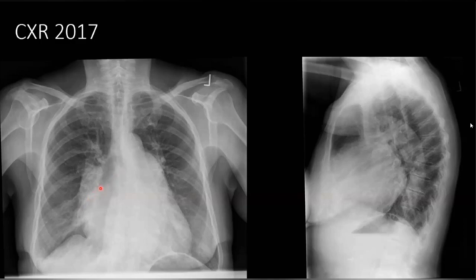As I was saying, this patient is a young female, and what do you think about the heart shadow? Then it could be bilateral enlarged pulmonary arteries because the right inferior pulmonary artery is also very prominent. So it could be bilateral enlarged pulmonary arteries with peripheral pruning of the vessels, and it could be a case of pulmonary artery hypertension. Okay, that's good. So now, what do you think about the retrocardiac opacity?